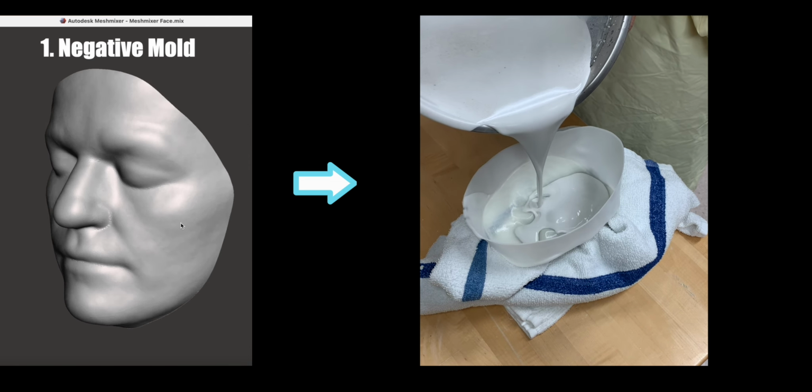The main thing is to get a basic surface of the face. You can do a lot of this with your own scanning software, but there may be certain problems that Meshmixer can help address. I'll be working with a non-watertight model, but you can use a watertight one as well. If your scan is exported with multiple files, make sure they stay together in one folder.